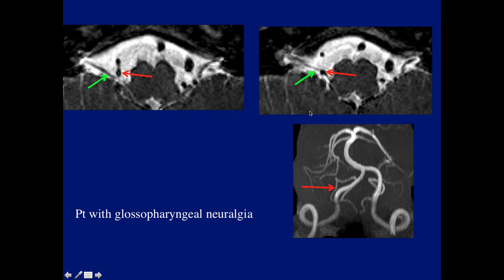And our only role, again, in this very complex nerve is to try to identify the possibility of a vascular conflict between a vessel, most commonly the PICA, and the glossopharyngeal nerve as it goes in. Although we don't know that that's what it is, we have to assume, because of the patient's symptoms, that that's the involvement mainly of that nerve.